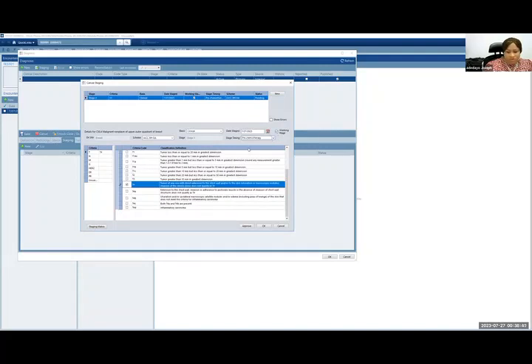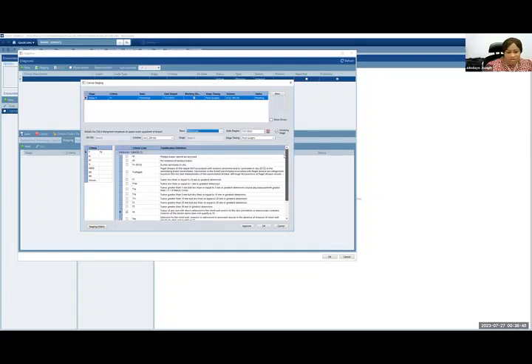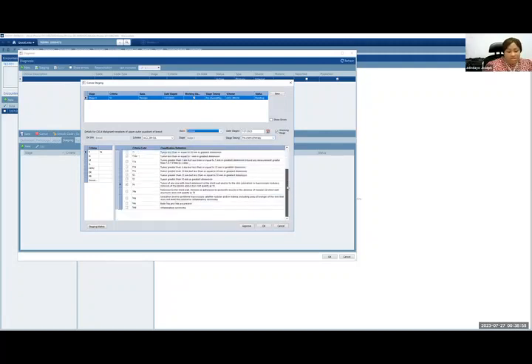I wanted to show something. Give me 1 second. If I go to post-surgery, and I click pathologic, ideally it should be pathologic criteria, but it's not. Okay. So as we were saying, this patient has come with a tumor that is greater than 2 centimeters but less than 5, a tumor that's greater than 5 centimeters, or a tumor that has an extension to the chest wall or skin or whatever. So we select whatever T stage we believe it is.